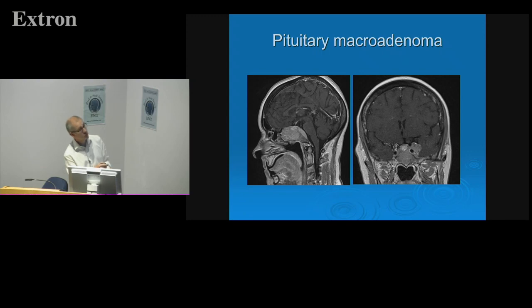This is an enlarged pituitary fossa. So there was something large growing in the pituitary fossa for some time before it got to this stage where there's loads of tumour everywhere. So that's just a clue that it's likely to have been a pituitary tumour. And those are the sort of things that maybe on CT you can pick up more easily than on the MR.